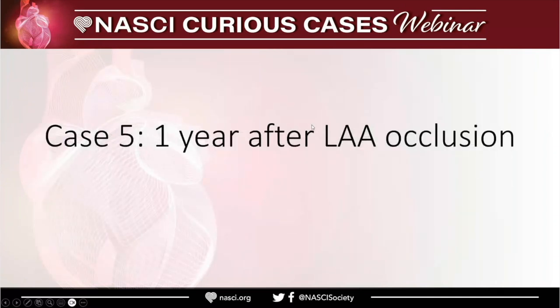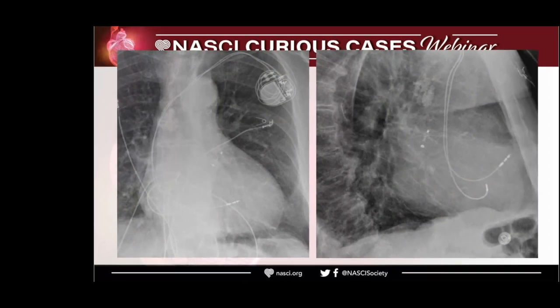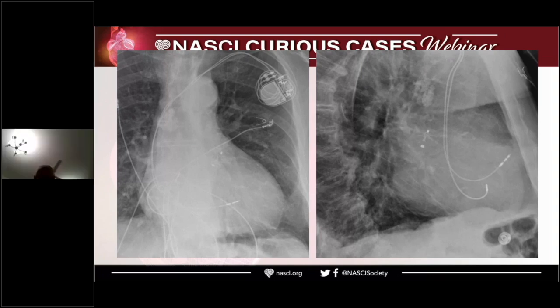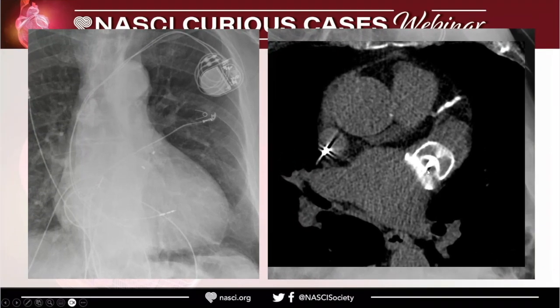So I have time for one more. Left atrial appendage occlusion. I think you guys are doing a lot probably. This is a patient with left atrial appendage occlusion post follow-up. You can see the device on your X-ray. I will not name the vendors. This has a lobe that is nitinol. Then you have a disc proximally, which they claim closes the appendage properly and also prevents device-associated thrombus, and then a waist here that helps to accommodate different kinds of appendages.